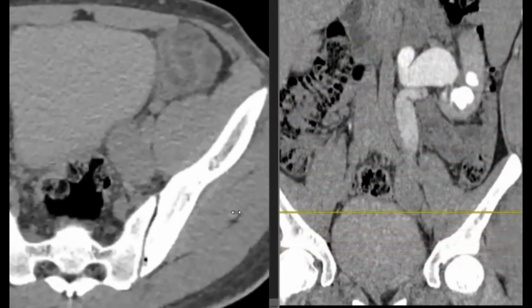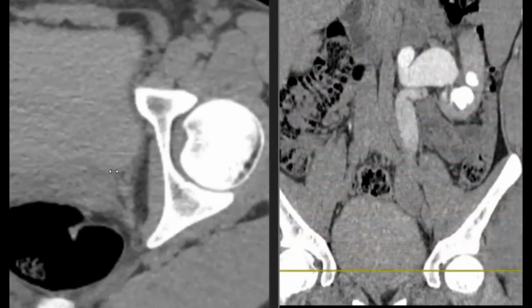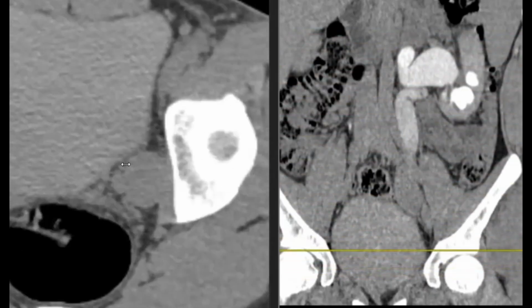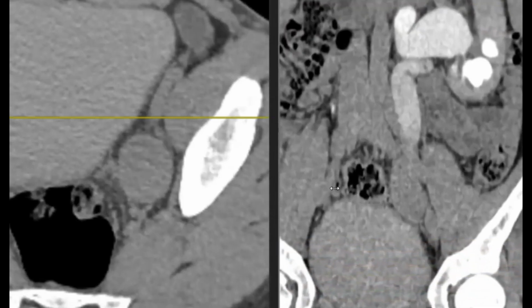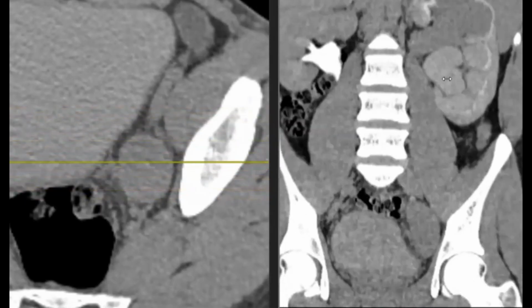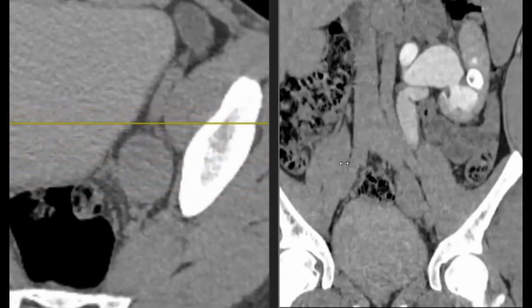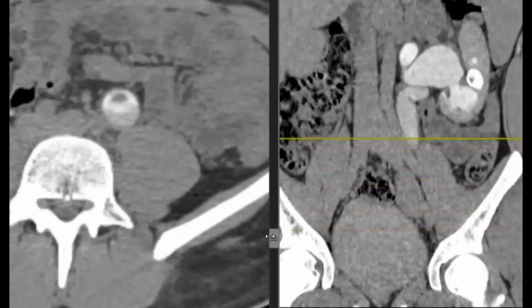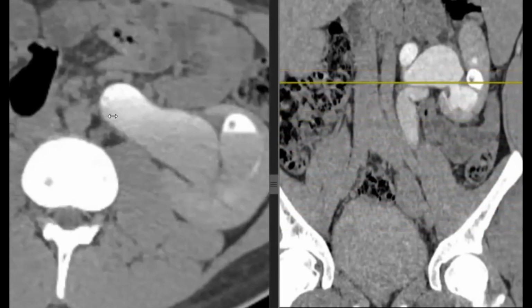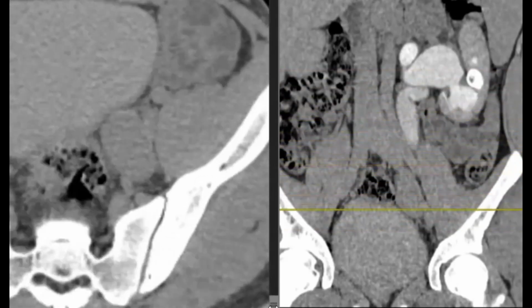If you look at the vesico-ureteric junction here, there's absolutely nothing. It's perfectly normal, a normal ureter joining the bladder. No stones, no masses, no filling defects, no irregularity, no stricture. Exactly. And the kidney is still functioning. So what I think is that it's a case of primary megaureter. Of course, you can see some debris within the ureter, like for example here. This is probably related to stagnation. Maybe blood, doctor, maybe pus.